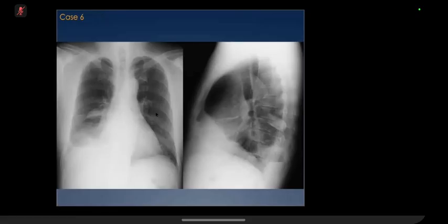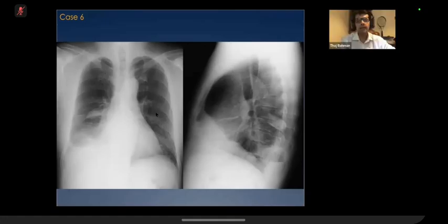Yeah, maybe changing the position of the patient, lateral decubitus. You're nearly there. So you do a frontal X-ray, and then you do a lateral X-ray. Now, if it is in the pleural space, the width of the horizontal air fluid level will vary in the frontal and lateral projections. You can see that's a narrower width in the lateral projection. It's a wider width in the AP or frontal projection, and because of that, it's in the pleura.